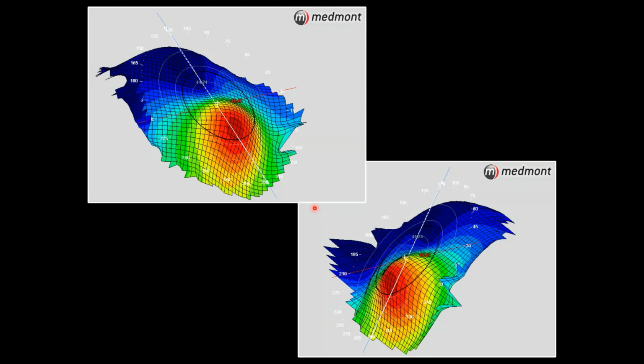So again, for a patient who has keratoconus that has a hard time understanding what you're talking about, you have corneal thinning. So what? What does that actually mean to me? Why is it that my vision is so poor relative to a healthy, normal cornea? And of course, seeing the eye in this perspective scaling gives us a much better understanding, gives the patient a much better understanding of what their eye shape may be contributing adversely to their quality of vision.